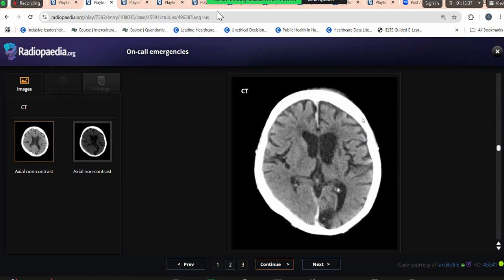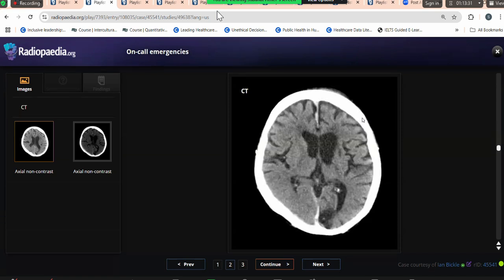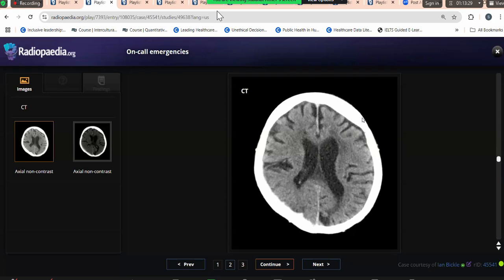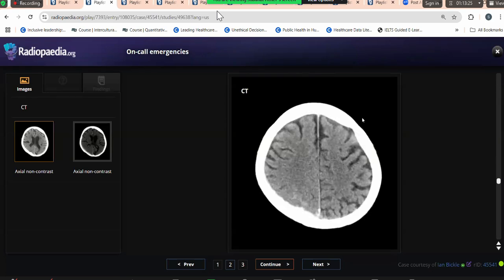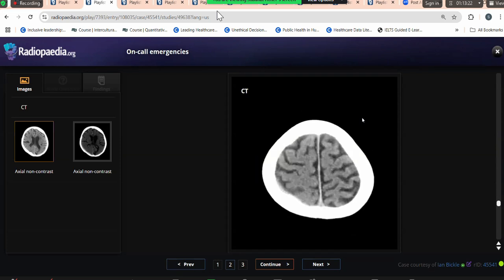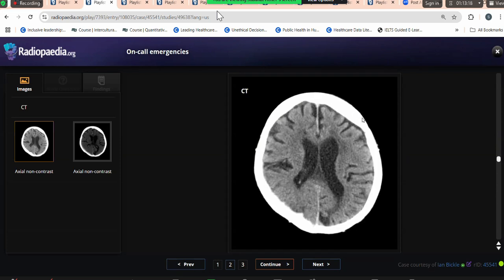I'm reviewing these brain findings again to look for any other important acute finding, in addition to the age-related changes of the brain parenchyma. And the hypodensity that I noted can be secondary to chronic encephalomalacic changes, secondary to previous infarct in the left occipital lobe.